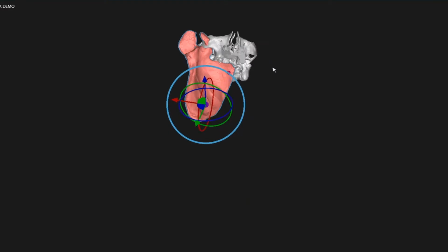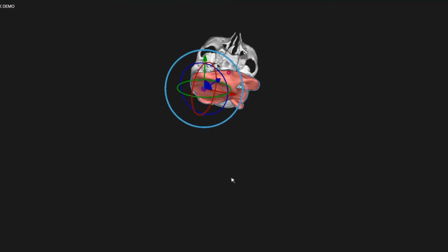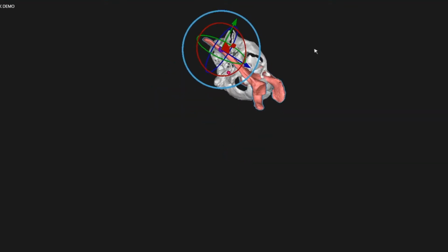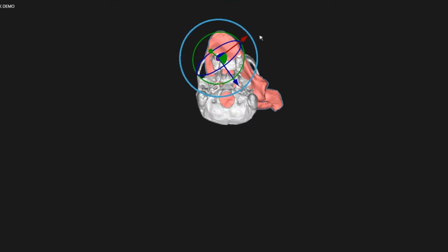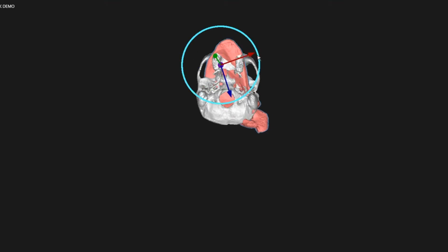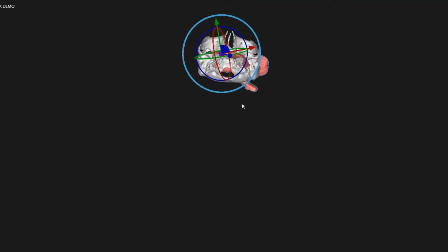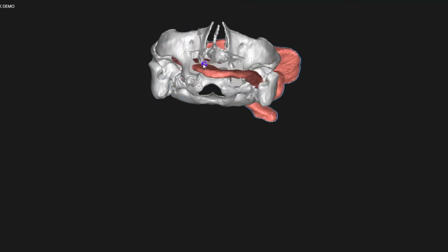Would you orient it so that the superficial side is superior, and then place the scapula tip? Just to make it easier, the tip goes towards the anterior aspect, and the concave side becomes the new hard palate. So the deep side is facing inferior. I think you had it actually.